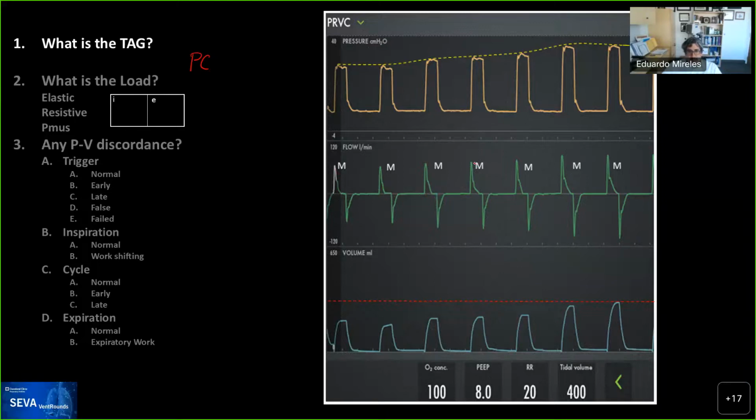And then the adaptive targeting, what adaptive, as you all recognize, means is the target in this case is 400. So you came to the bedside and said, I want 400, which is outlined by this line that we draw here. This is not present on the ventilator. And you can see that at the beginning, the breaths are being delivered by the device, and the volume is not reaching the target that you wanted.